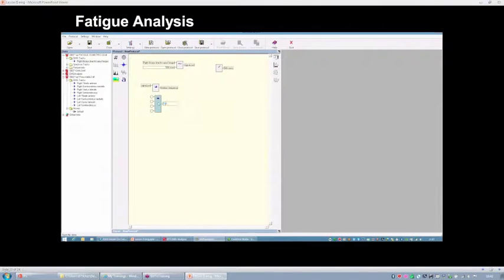So to compute the fatigue, you have some different options in our EMG analyzer application. The block I'm going to use is specific for the computation of isometric fatigue. In this case, the first input has to be the raw signal, and then you have to define the two events which define the signal portion that you want to analyze. So I'm going to define the start and the stop of the time window with respect to which I want to analyze the signal.